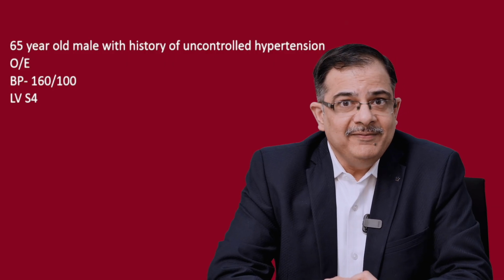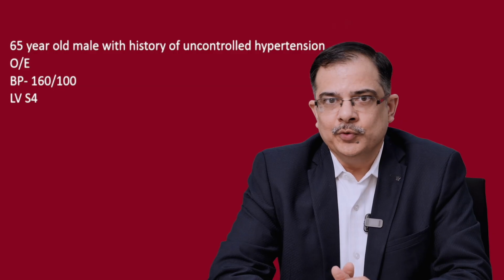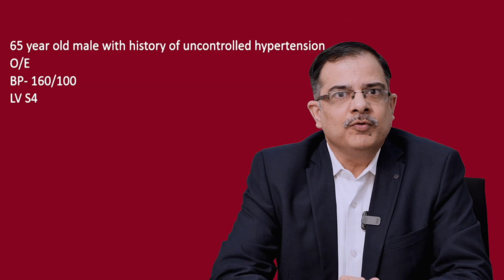And there is an LV S4. That confirms that the left ventricle is stiff due to LVH. So we will look for the signs of LVH in the ECG.